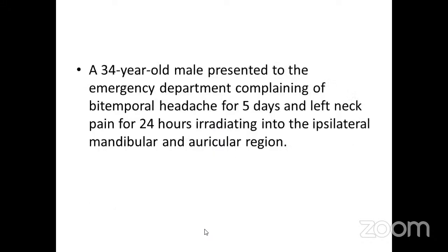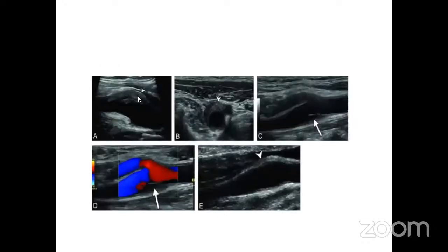So here is another case where a 34-year-old male presented to the emergency department complaining of bitemporal headache for 5 days and left neck pain for 24 hours, radiating to the ipsilateral mandibular and auricular region. You can see in the ultrasound some perivascular infiltrate around the carotid wall, which the arrowheads demonstrate.